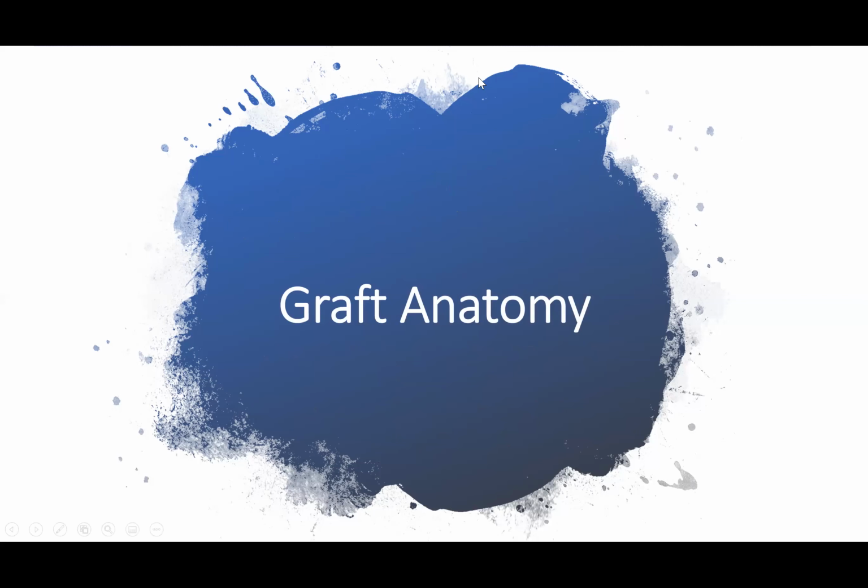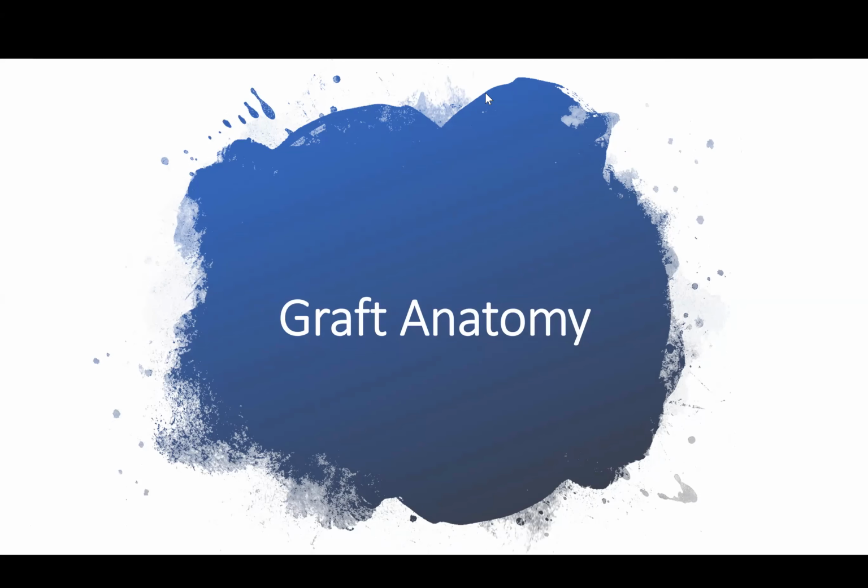And the surgeons have different ways of putting the grafts, and it's important to know what type of grafts are there.